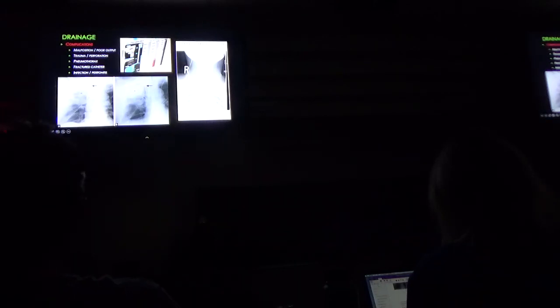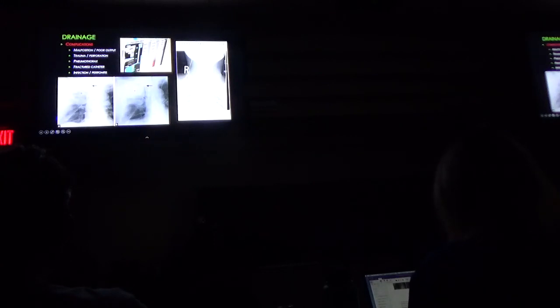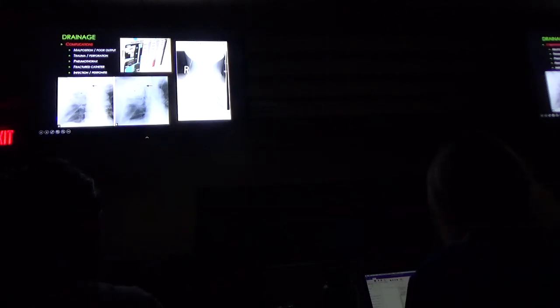There's another picture of a line that's fractured on that one. So again, when you're looking at lines, make sure that the line on both sides lines up all the way through. Sometimes it may look fractured because it is a kink like this, and it actually came down and goes up like this. So it's not a bad idea sometimes to not only get an AP, but also a lateral. So if you're suspicious of a fracture, it may just be kinked in there. So confirm that with the lateral as well. Makes a difference with whether it's replaced or not.